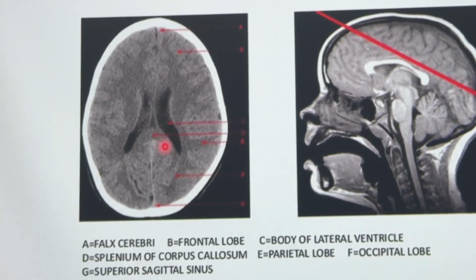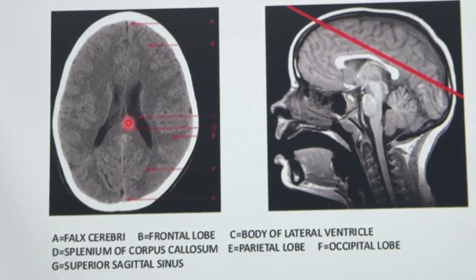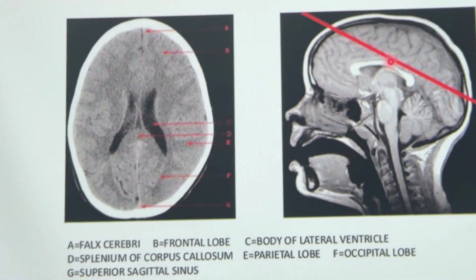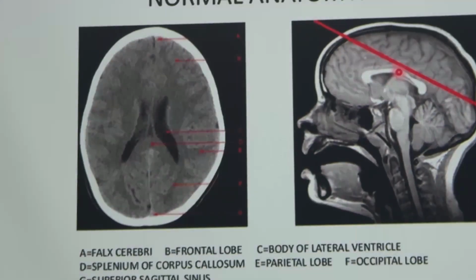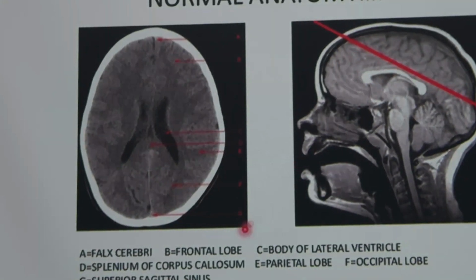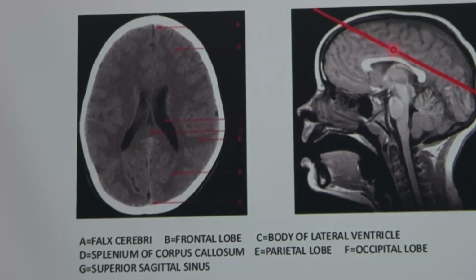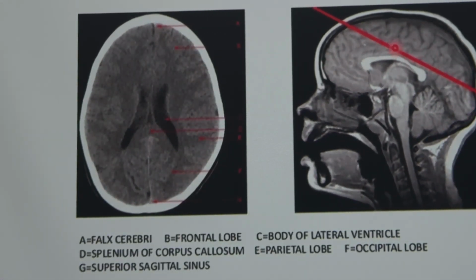True body of the lateral ventricle is appearing on the right and left. Here, the cut is passing through the posterior part of the corpus callosum, which is the splenium, and this is the body, and this is the genu. The parietal lobe starts to appear on both sides. We are approaching this area. Here the frontal, here the occipital, here the parietal lobes.